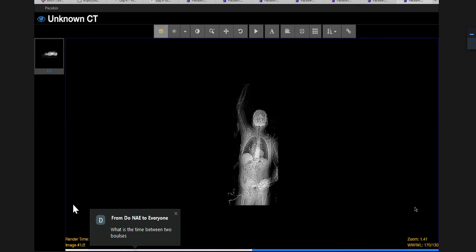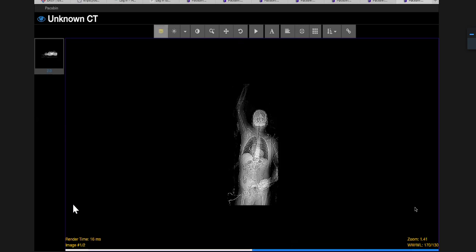How would they look in the CT? What's the position? The hands should be both lifted up, to avoid any artifacts. Usually we try and do that, don't we? Because it really reduces the streak artifact, doesn't it? Yes, that you see.